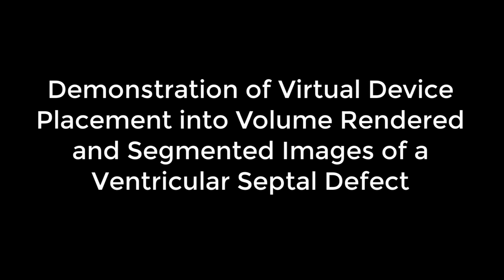We will demonstrate virtual device closure of a ventricular septal defect. Device closure of ventricular septal defects is challenging due to the proximity of the defect to critical adjacent structures such as the tricuspid valve and the aortic valve.